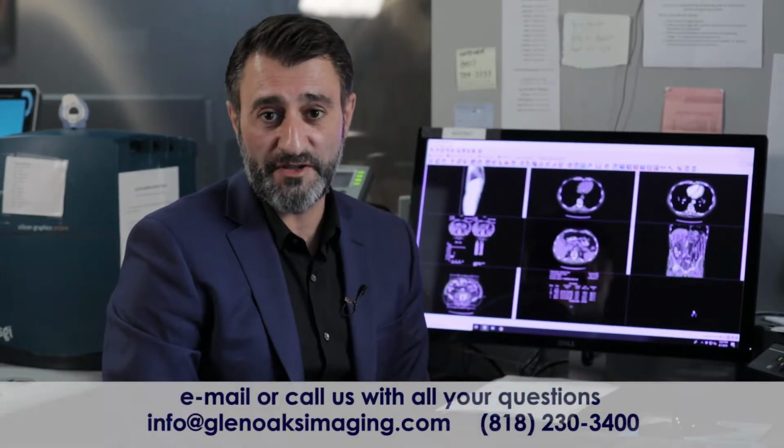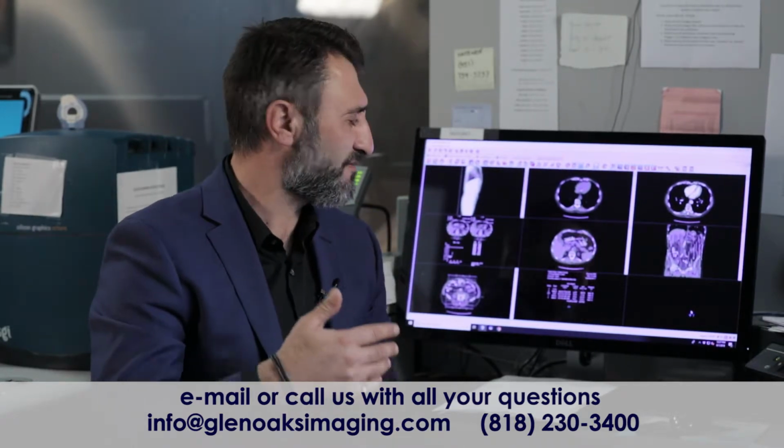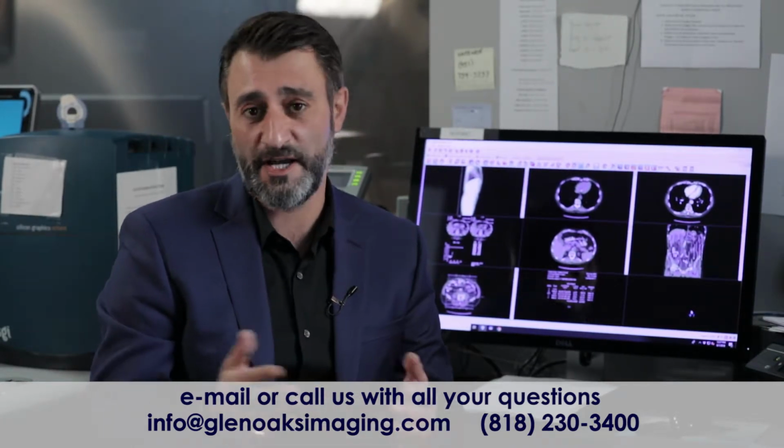As you saw earlier, Rubik showed you images of an X-ray and an ultrasound and what an abdomen looks like with those modalities. We want to take it a little bit further, a little more into detail, with more sophisticated studies, a CT of the abdomen.